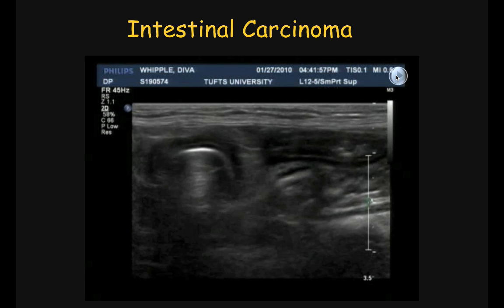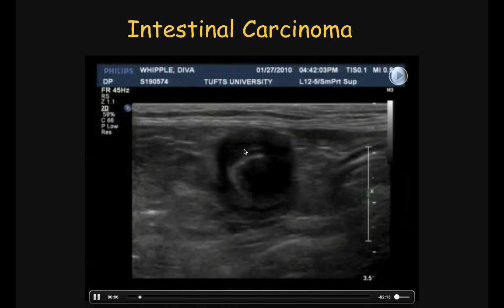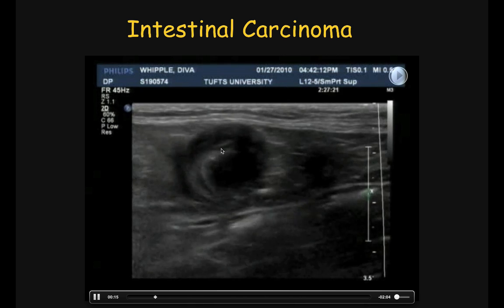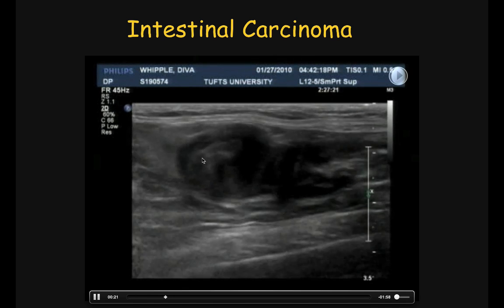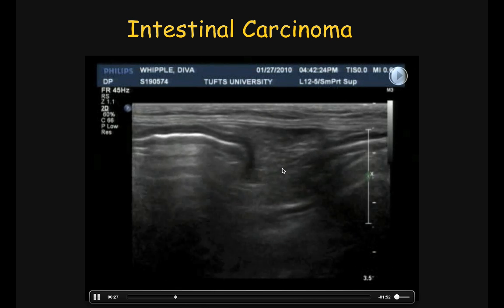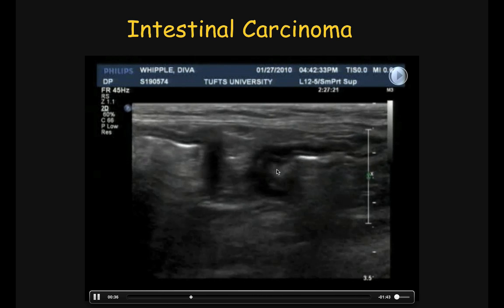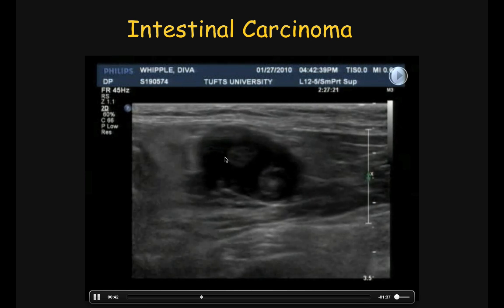And in this example, we see a lesion with loss of layering that is right on the margin of a dilated bowel segment that is mostly gas-filled on the left. Here's the gas-filled dilated segment, and now we go to this lesion, which is primarily involving circumferentially a short segment of this jejunum. We see the lumen at some point being really squeezed within that segment. Here is the lumen.